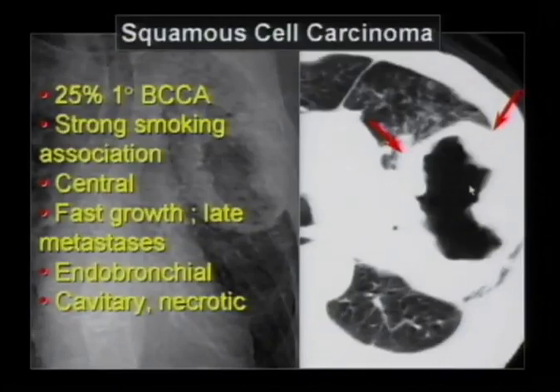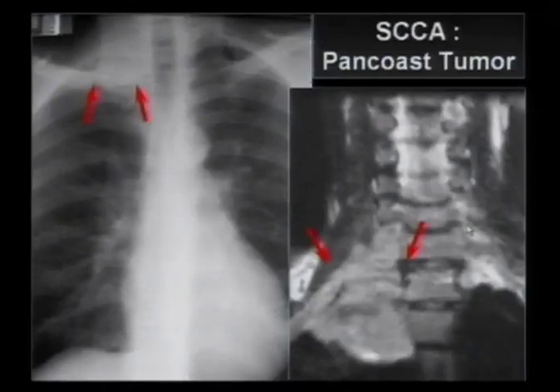When you see cavitation and you're looking at a lesion that's cavitary on a radiograph or a CT, we look at the inner character of the wall and the wall thickness, which you characterize at the thickest area, not the thinnest area, but the thickest area that doesn't have an air fluid level. And this feature allows us to diagnose this lesion as malignant. It's probably in excess of 2 centimeters thick here with a lobulated internal character that strongly suggests neoplasm over an inflammatory lesion. This is actually your first unknown.